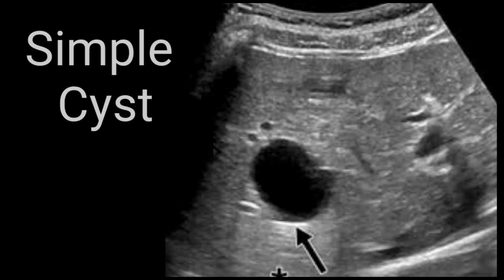So one possibility is cystic metastasis, but as this cyst is very round, very clear, and looks like a primary cyst, for a primary cyst within the liver, and if it is singular, the best protocol is a follow-up scan after 6 months, and if the size remains unchanged, there is no significant increase or enlargement in the size of the cyst, or there are no other intracystic contents or hemorrhage or calcification, advise the patient for a follow-up scan after 1 year. So the surveillance scan could be after 1 year.